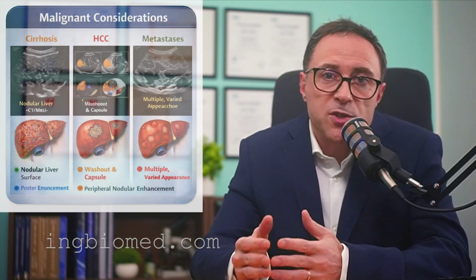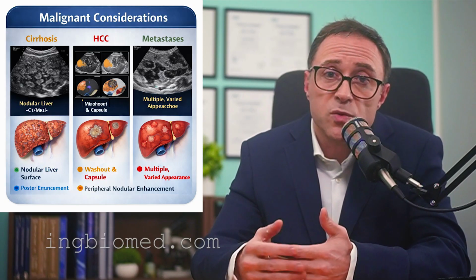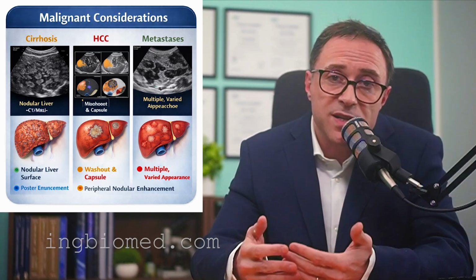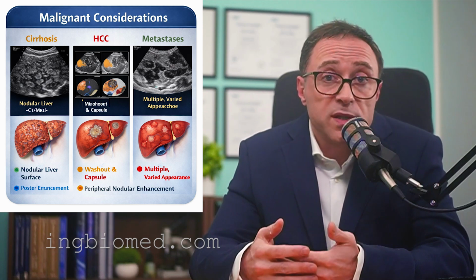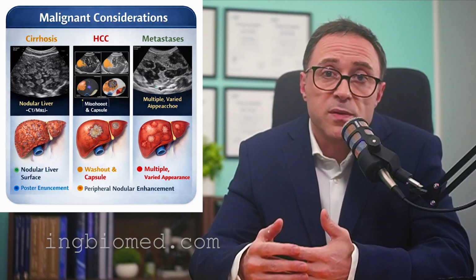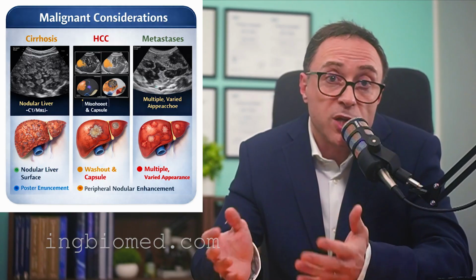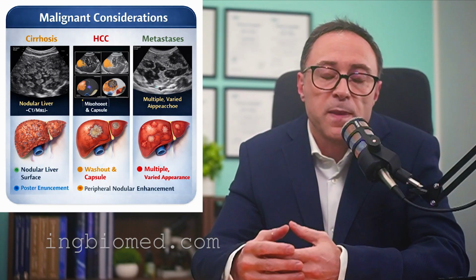In cirrhotic patients, systematic screening is essential. Cirrhosis leads to surface nodularity, heterogeneous echotexture, altered vascular architecture, and signs of portal hypertension. In this context, early detection of hepatocellular carcinoma is critical. Suspicious lesions often show arterial phase hyperenhancement followed by washout in later phases on contrast-enhanced studies.